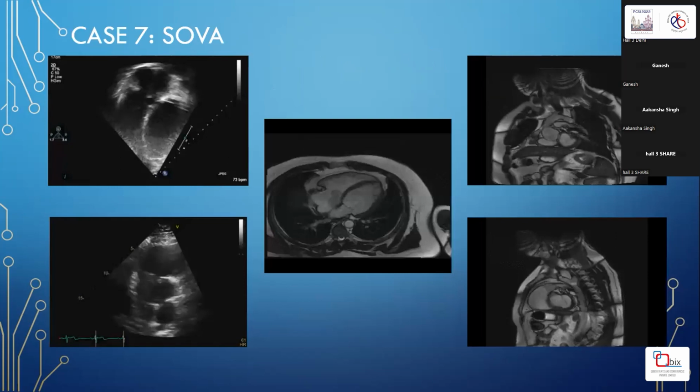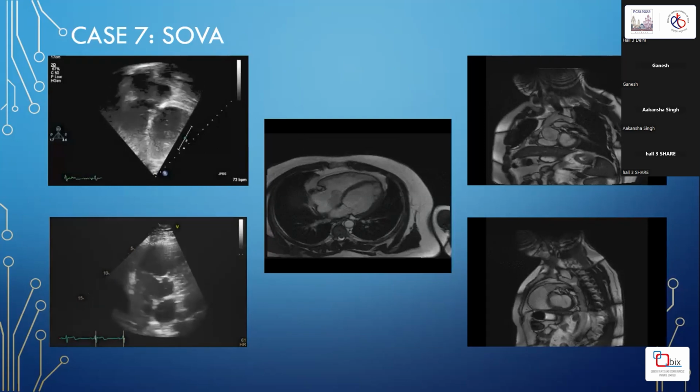Cardiac MRI is an excellent tool for serial surveillance of patients with bicuspid aortic valve and aortopathies. So this was an adult with poor echo windows and essentially an innocuous looking transthoracic echo. The 4-chamber on the MRI showed us a suspicious looking cystic lesion already. The arch was essentially normal on cine imaging.